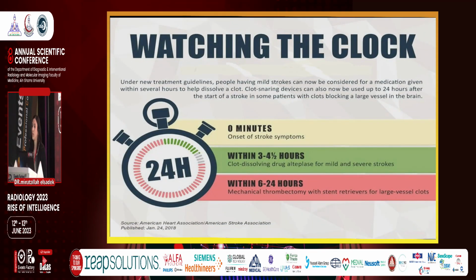Now, although this patient presented late to the ER, almost 24 hours after the onset, yet new studies suggest that according to MRI images, by assessing FLAIR diffusion mismatch, the patient can be subjected to extended windows of thrombectomy, especially in young age groups.